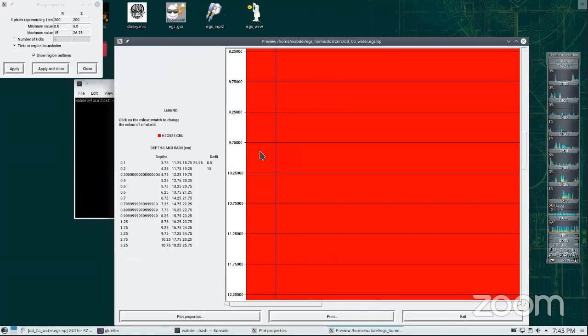So instead of this region being 0.5 centimeter, you want it to be 2 millimeters. It's up to you. Okay, the smaller the region, then the more histories you need to reduce your statistical uncertainties. But that is still fair. Okay, clear so far?